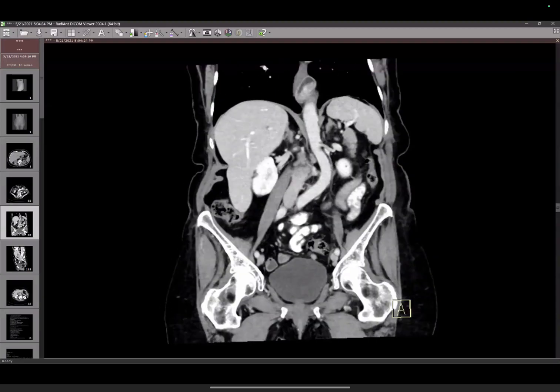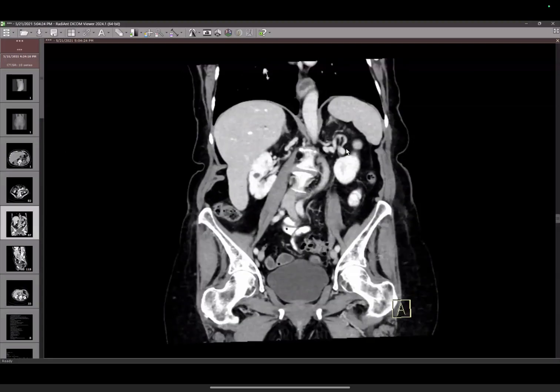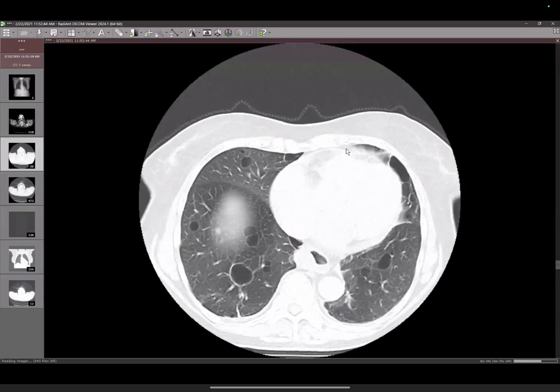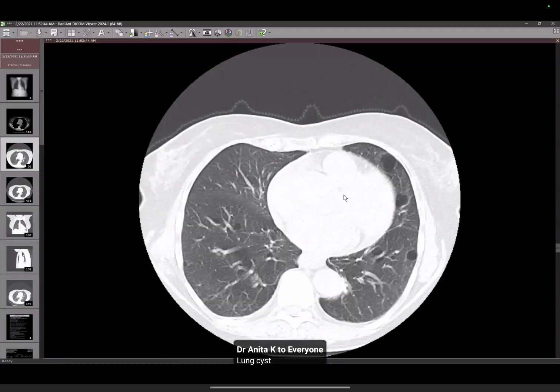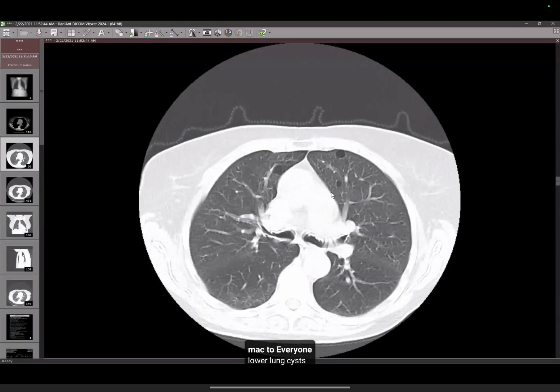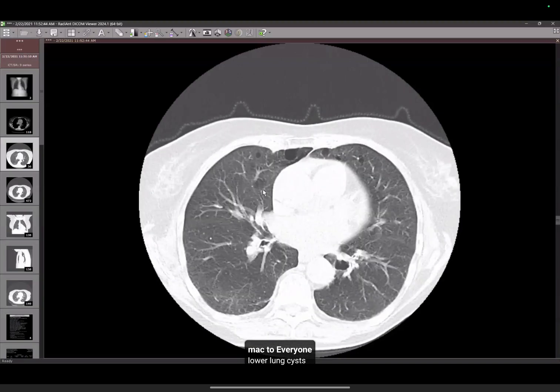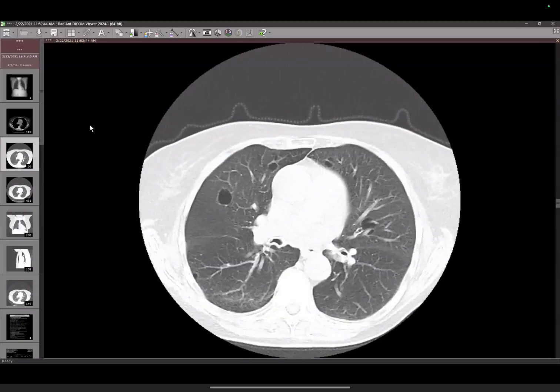So what else do you see in Birt-Hogg-Dubé syndrome? Fibrofolliculomas on the face and chromophobe RCC. Lung cysts. What do you see in the lungs? Lung cysts with basal predominance. LAM? No. So this is the same patient's chest.